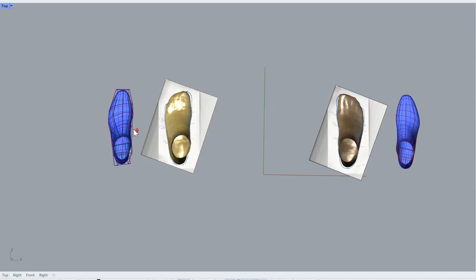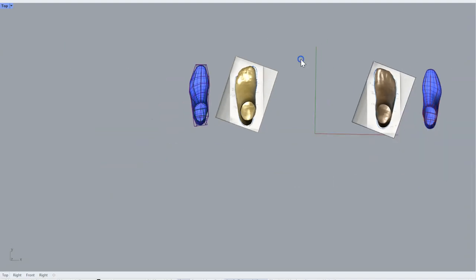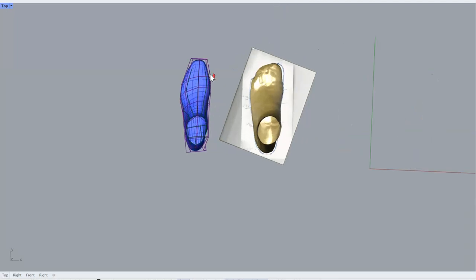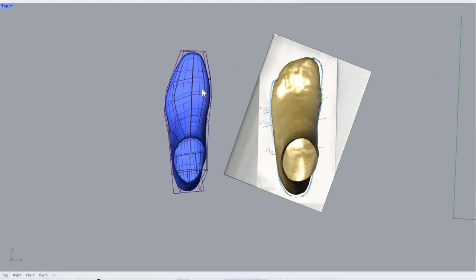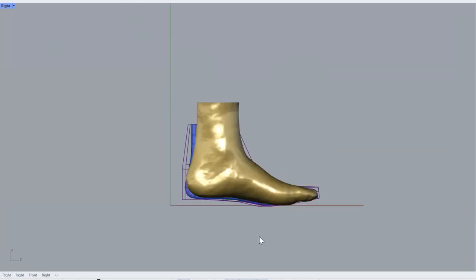Okay, first thing, I'll hide right. I'll start with left now. And the first thing is I make this last a bit transparent so it's easier to see what I'm doing. And I'll hide the blueprints. And I can go to this.